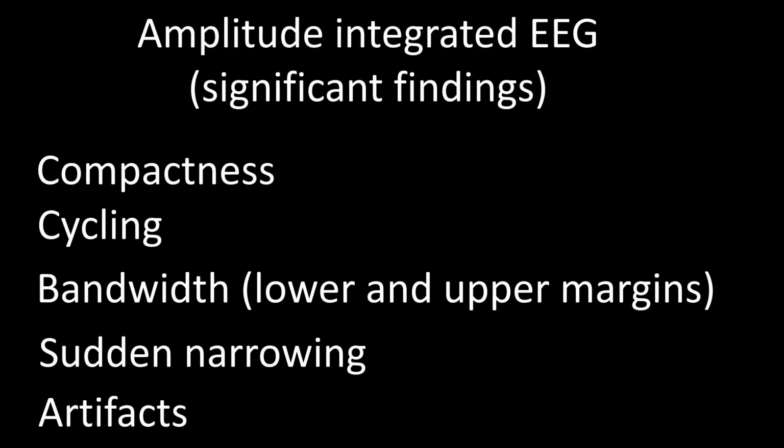Recall that in a prior video we presented a method of reading amplitude EEG. We will put it to use in this talk. Amplitude EEG is read by epochs. An epoch is a fixed period of time that should be kept constant within a recording but may vary from one study to another. Often institutional protocols or manufacturers' specifications dictate the duration of an epoch.